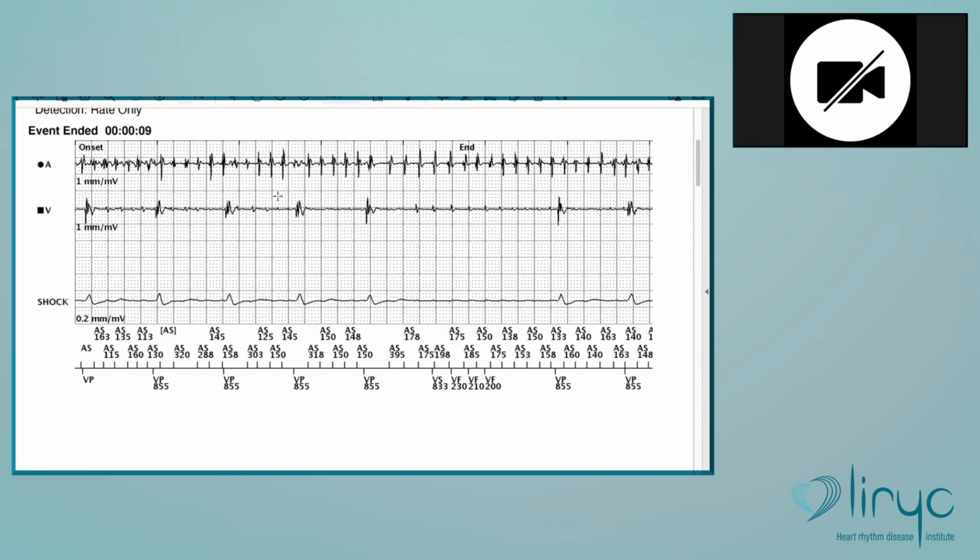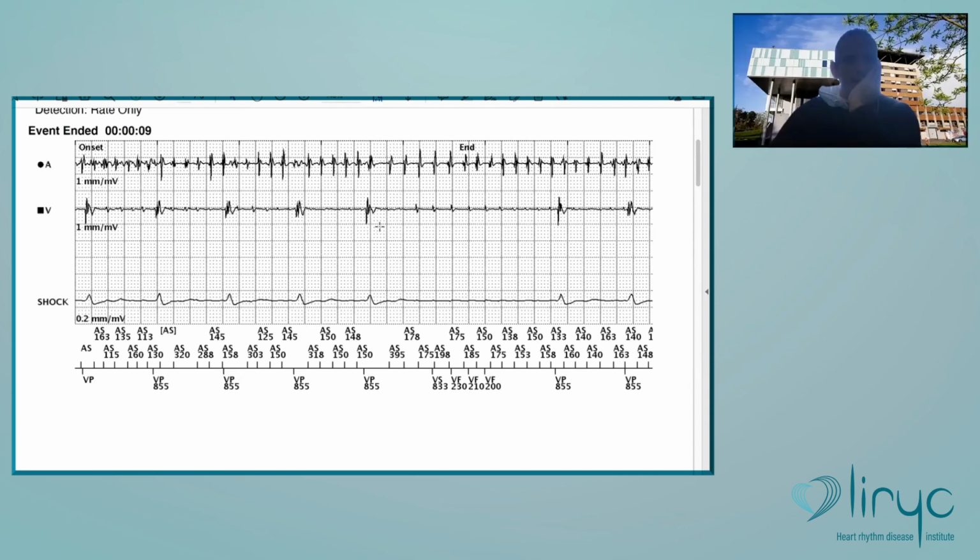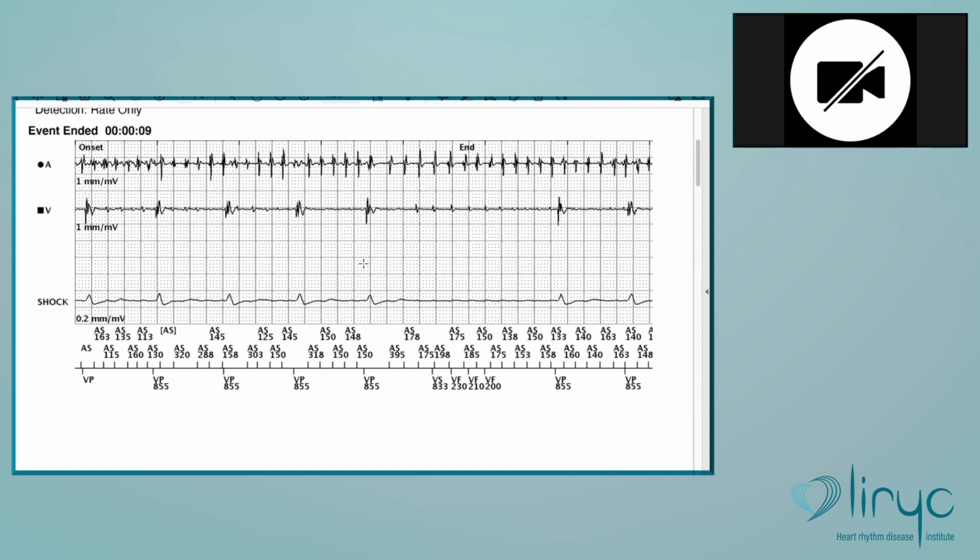So we see there's AFib on the atrial channel, and there's oversensing of the atrial signal on the ventricular channel. Yes, clearly you see here. So this patient is dependent. You have to understand something: when you are dependent, oversensing is a problem for 2 reasons. First, in Boston devices, it appears that you are much more sensitive after pacing than after sensing in the right ventricle. Do you understand that?